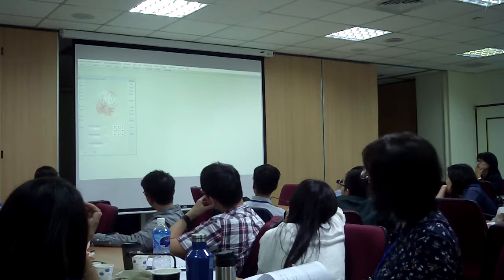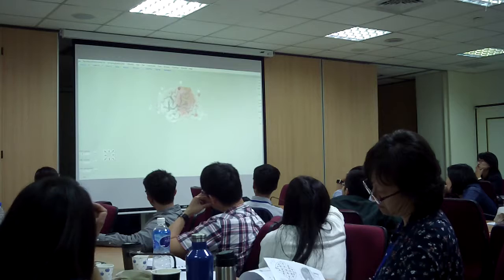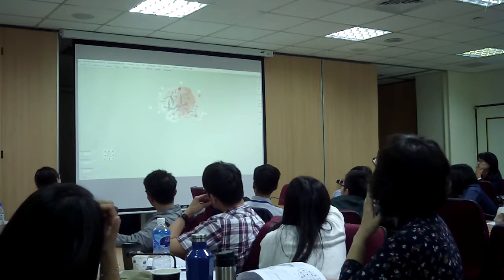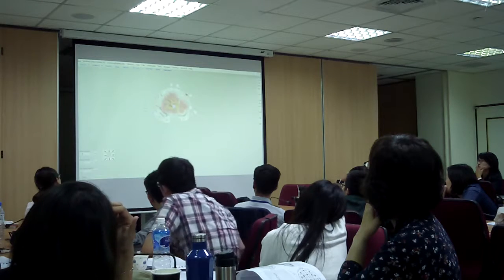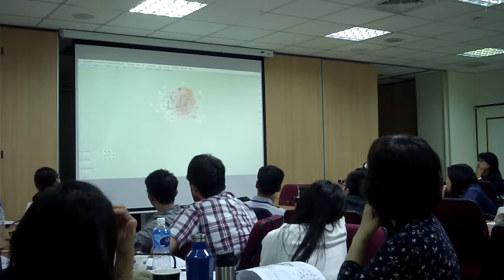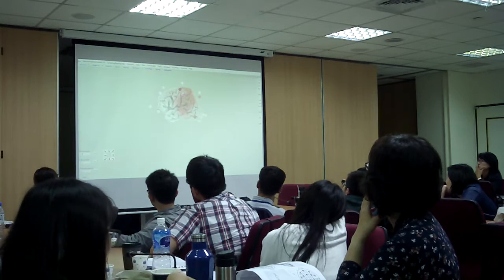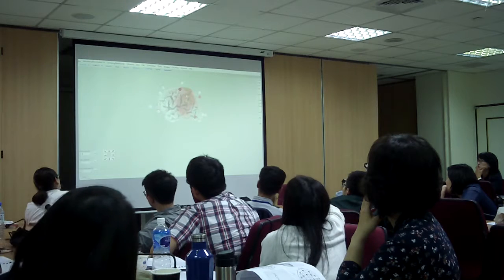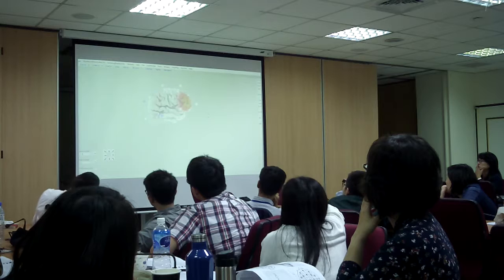And here you have that. So here's your Brodmann area 42, and you have some frontal compromise as well. So you can rotate this, and it gives you a pretty good idea. But see that right there? So the auditory processing and some executive functioning processing.